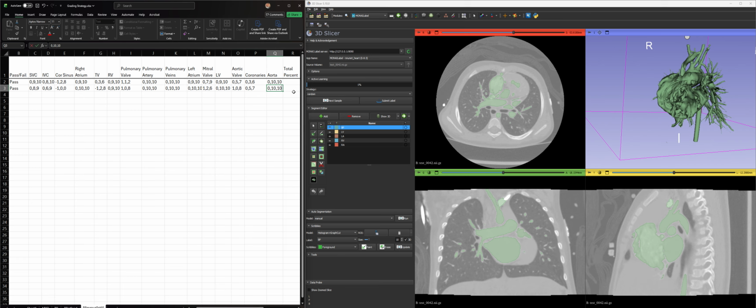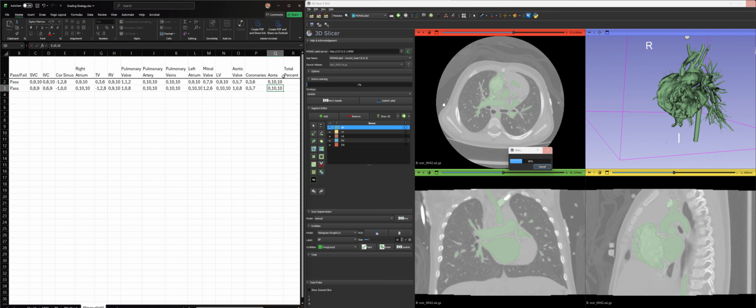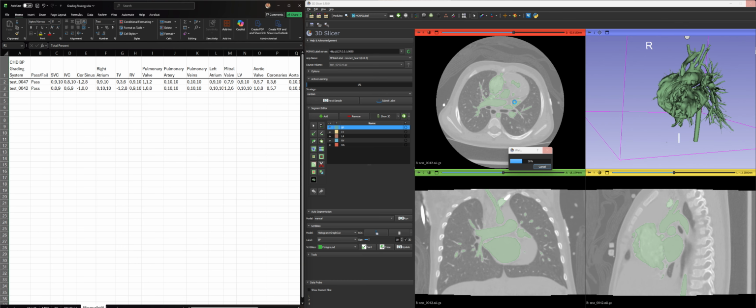And that should conclude our session. I hope this was helpful and that this serves a purpose of sort of locking in the grading, at least for cardiac. You should be able to use this same sort of ideal for the myocardial segmentations as well.